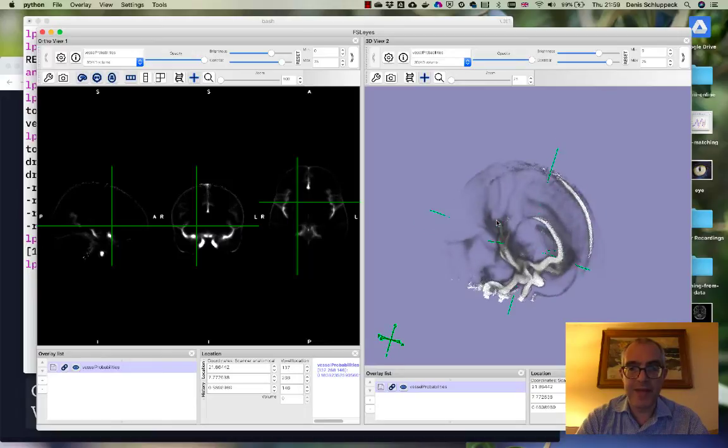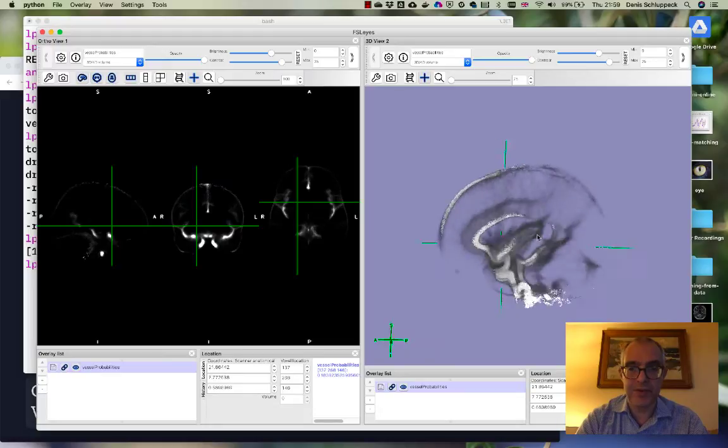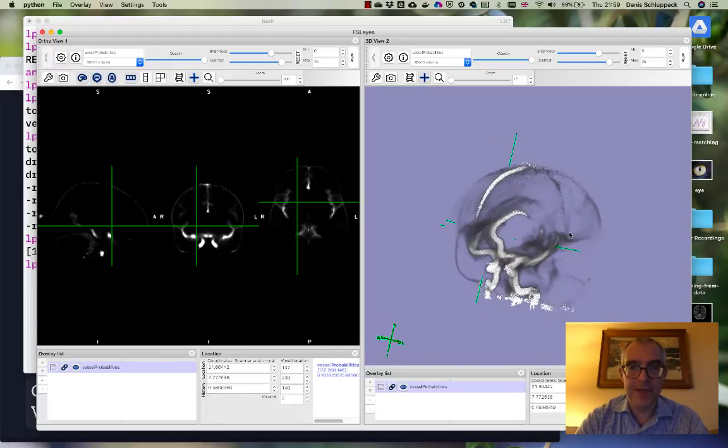And I haven't played around with exporting the data files. It's definitely possible, but I don't know the command that's there, okay? And again, we can change the intensity range here. So it's inherited the values that we've taken from over here when we press the button.